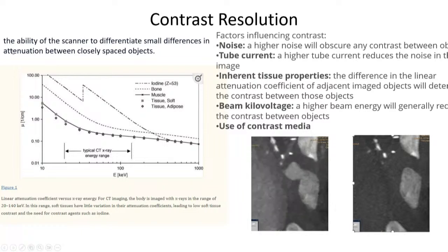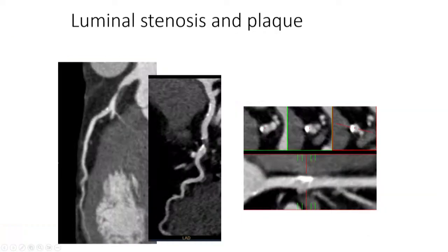Okay, so again, contrast also allows us to characterize the plaque, either it's calcium or soft plaque, okay? Or lipid-rich plaque, depending. Again, remember I said, if you have lipid-rich plaque, the Hounsfield unit is going to be much lower than, let's say, fibrotic or calcium. So those are 3 major components we can more or less distinguish, and that's with the use of contrast.